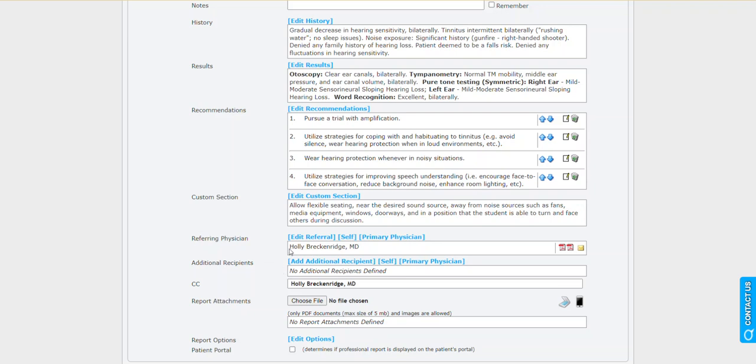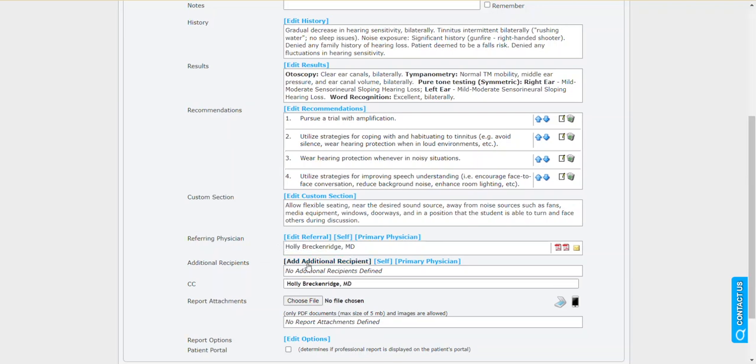This may be, okay, we're sending this to the primary care physician plus their ENT or something. Or maybe this patient was self-referred, but they did request, or you asked them if they wanted, their report sent to their primary, in which case you added them as an additional recipient, right? Or let's say you're sending this to the primary, but you also work with the school district and you need to send this out to 7 people.